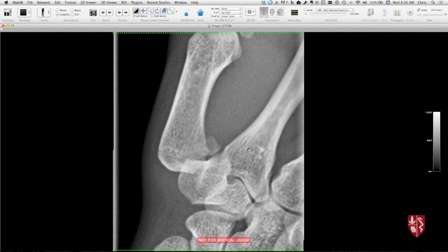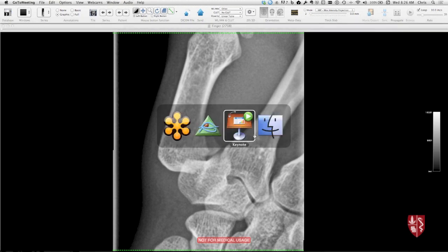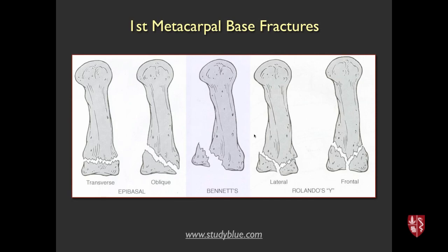Not quite Gamekeeper's. We'll look at something like that in a minute. Bennett's fracture. Very good. Okay, so I can't remember these names myself that much. And what happens is if you start putting eponyms in reports, then often we disagree with the orthopedic surgeons. So it's probably better to be generic about describing things. Descripting, it's a new word. Don't put that in either.